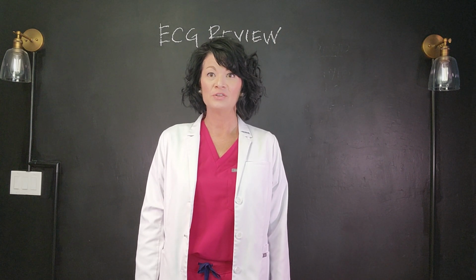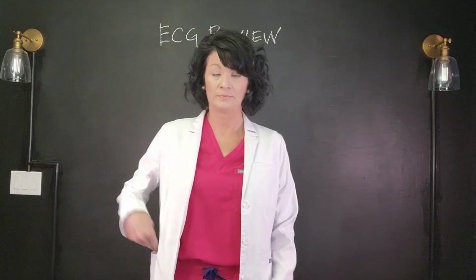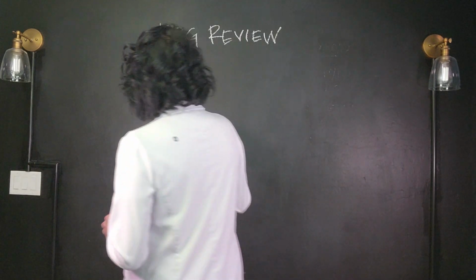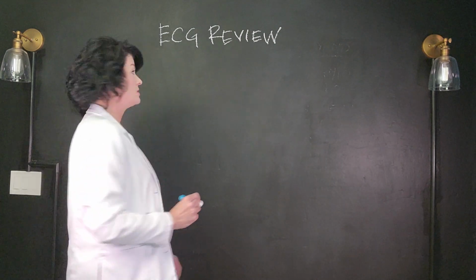Professor Butler here. Just want to do a quick video on ECG review. Okay, so just a quick reminder, let's talk about what is happening with the ECG.